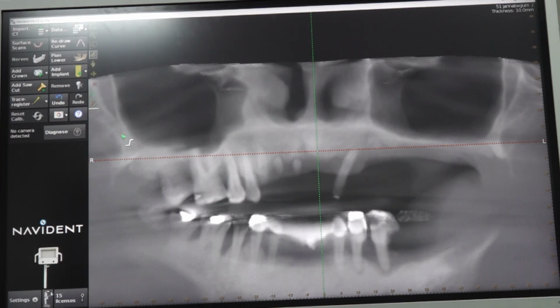So the tentative plan will be placing 2 pterygoids and 2 implants in the 1 and 2 region, and 2 implants in the region where we engage the nasomaxillary buttress. From where we are angulating only we change. And here we may angulate from premolar to nasomaxillary buttress. Here we may come till the canine, first premolar. From where we are starting, it may be different, but where we are ending, it will be in the nasomaxillary buttress. So totally 6 implants. So all on 6 planning.